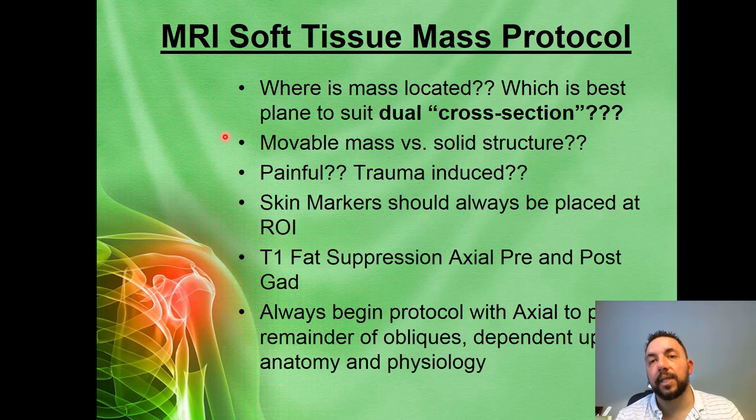Let's even look at the knee as an example, and we're going to get to that shortly. Anytime we're evaluating the cruciate ligaments, which are housed in the anterior to posterior dimension, our scan plane that's most appropriate is going to be our sagittal plane. However, when we're looking at our collateral ligaments, the MCL, the LCL, one of them is the Tom Brady ligament, right? Anytime we look at the MCL and the LCL, which are housed on both sides of the knee, medial and lateral, always the best scan plane for those will be our coronal scan plane.